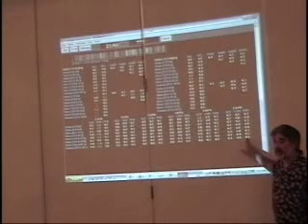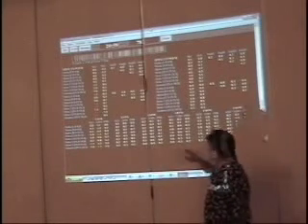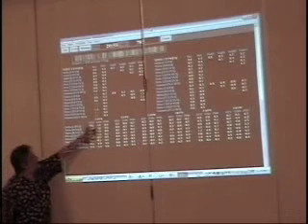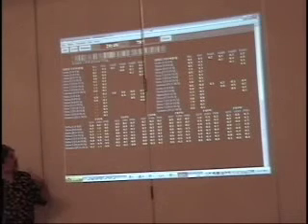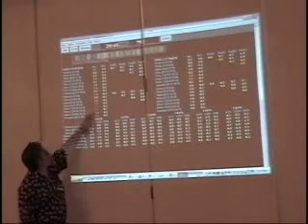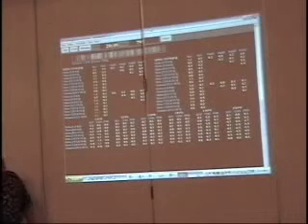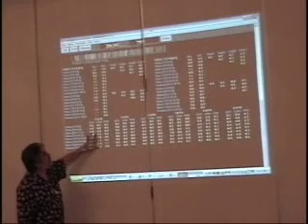That's 24 connectivity metrics. So what we're seeing is there's something going on here in the front. There's a little hypocoherence between F3 and F4. They're not talking as much as we're normally used to seeing. At the same time, there's excess beta at F4. There's right frontal beta activity, which is being seen. These are the components that are lighting up primarily.